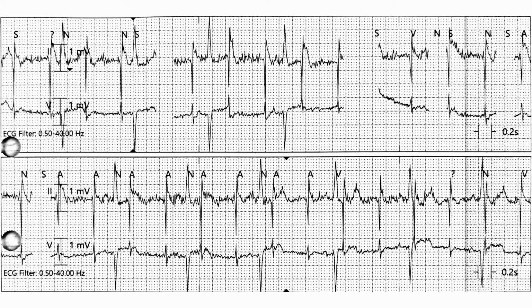The next thing I look at when I suspect artifact is look at every QRS in all the leads and ask yourself a question: does it look real? And I see that there are two populations of QRS complexes. There is this narrow QRS complex here that looks like this in the bottom lead, and then there is a wide QRS complex, or a wider one, here that looks like this in the bottom lead. And certainly the narrow one looks extremely narrow, almost too narrow to be real. It's not definitive, but we'll keep that on the back of our minds.